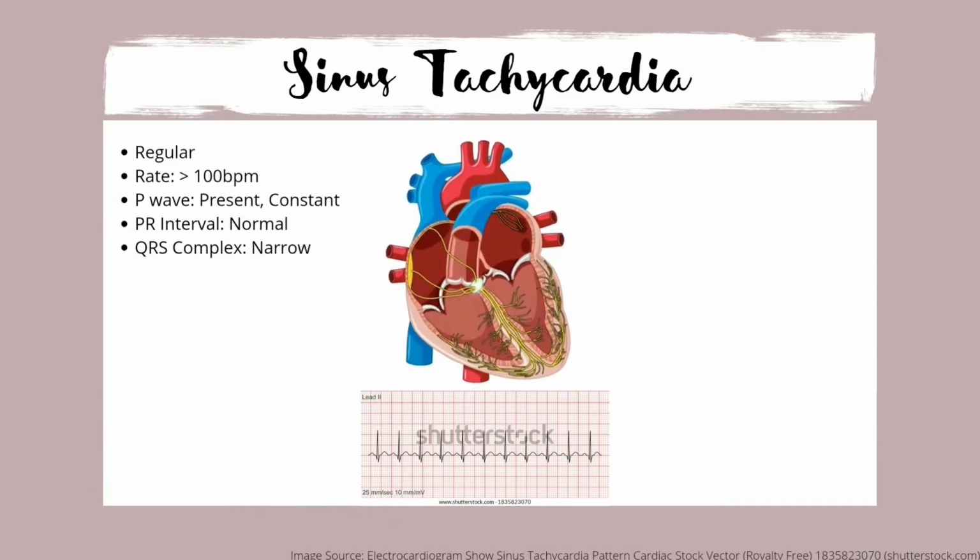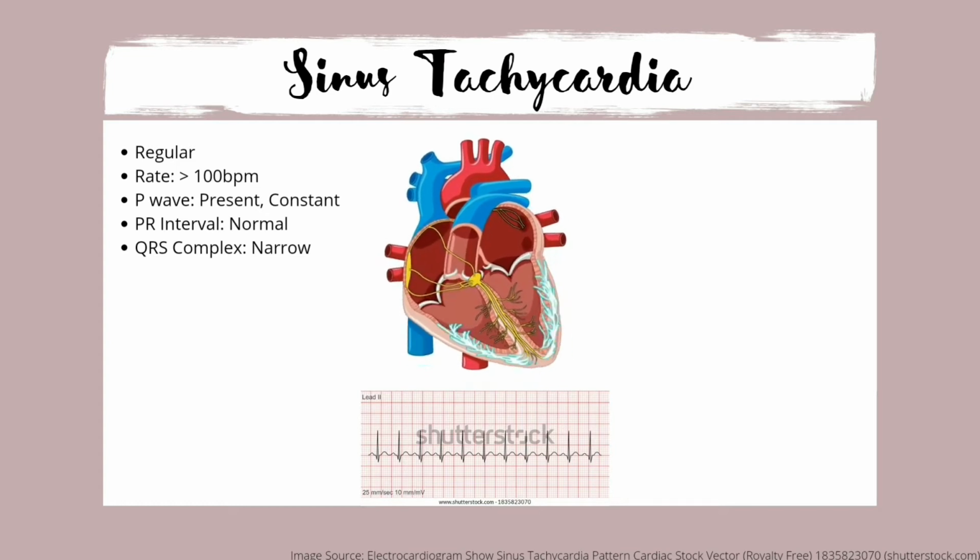Sinus tachycardia. Sinus tachycardia, also colloquially known as sinus tach or sinus tachy, is an elevated sinus rhythm characterized by an increase in the rate of electrical impulses arising from the sinoatrial node. Characteristics of sinus tachycardia. RR intervals constant and regular. Rate is greater than 100 bpm, but not usually greater than 130 bpm at rest.